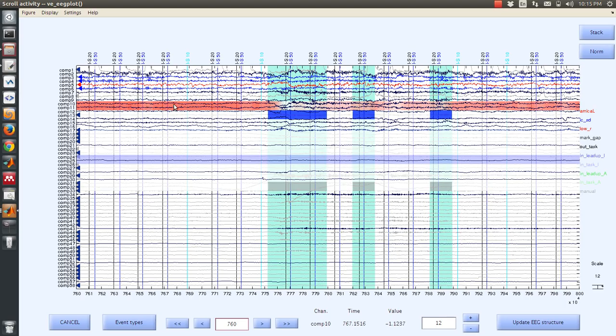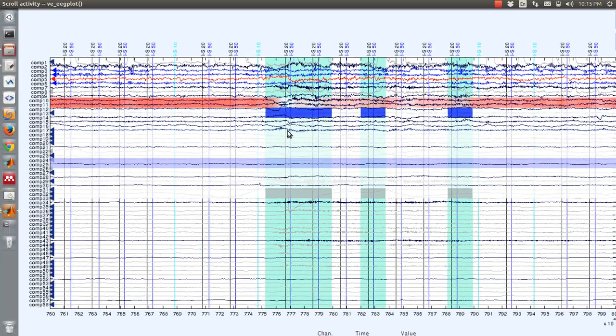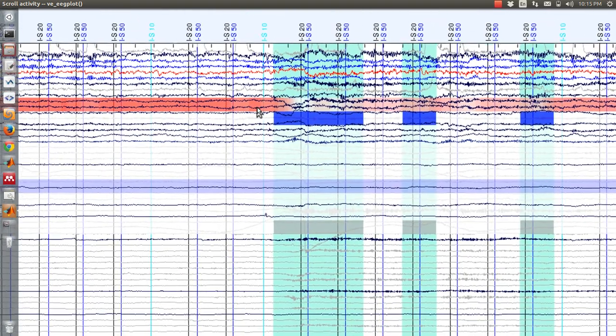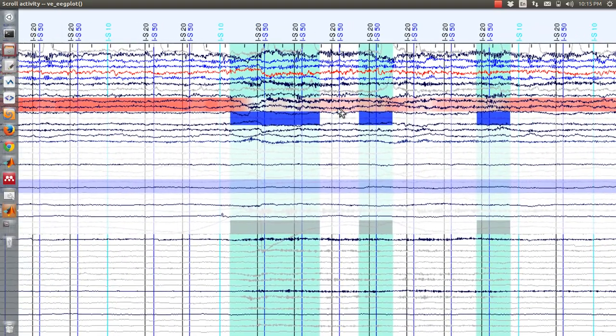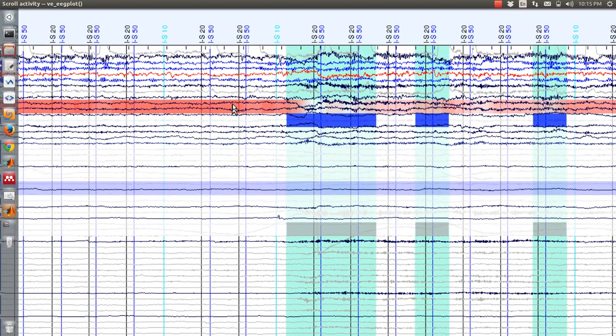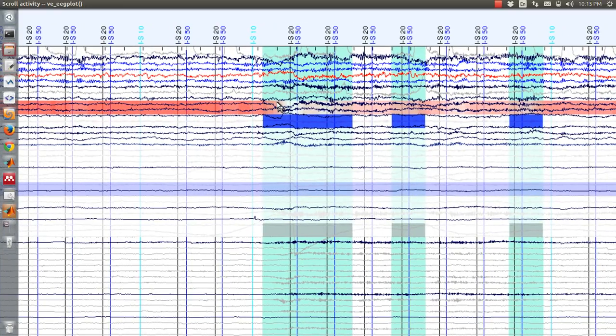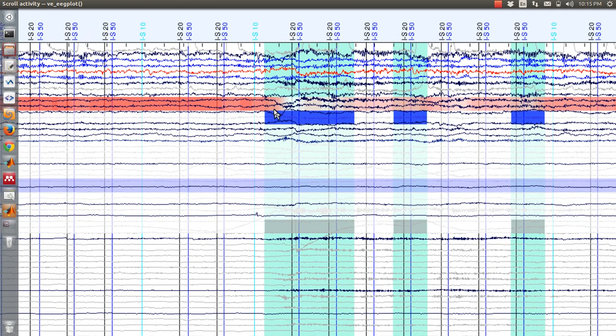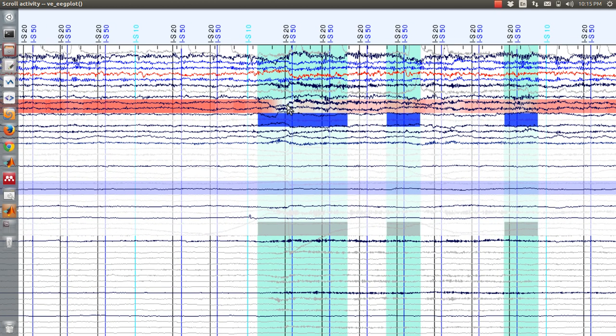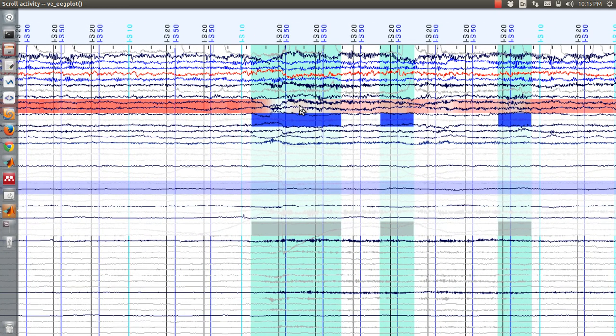But what we can see if we include the likelihood array of the Amica is that Amica does a very good job at finding those periods while it's doing it. So what we can see here is the red continuous variable dims out during this period of time, which just means the likelihood of the model has dropped during this period of time.